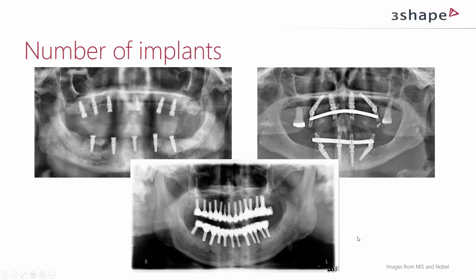I mean, you don't have to be a dental professional to see the difference here. I guess both ways of doing this are kind of the extremes for restoring almost full jaws. But both can be successful and both can have their issues. I think that's kind of the takeaway.